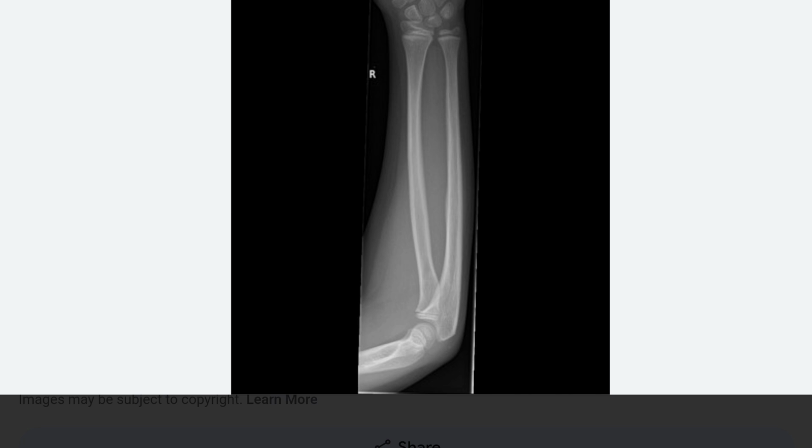Learn about classification of elbow joint dislocation and associated injury. What else would you keep in mind from this radiogram? This is an unstable injury, and if it is shown to be an old injury, then I will have to keep in mind the difficulty in reduction due to capsular calcification and possibility of myositis. How common is neglected elbow dislocation? Uncommon injury and rare to see in practice.